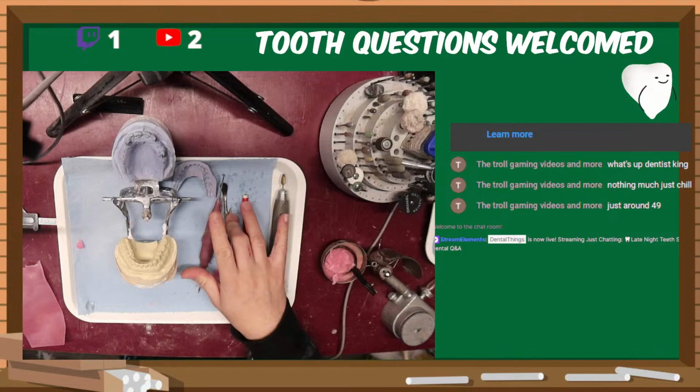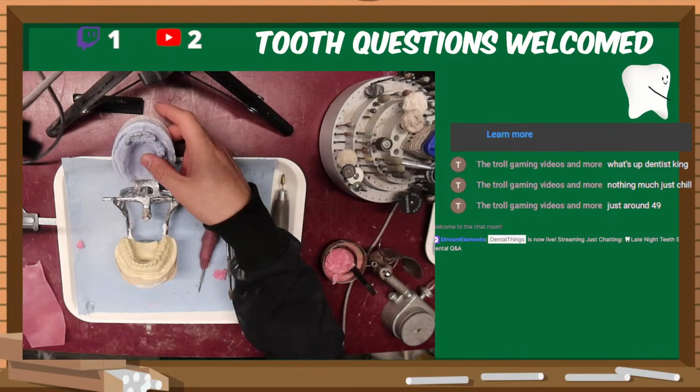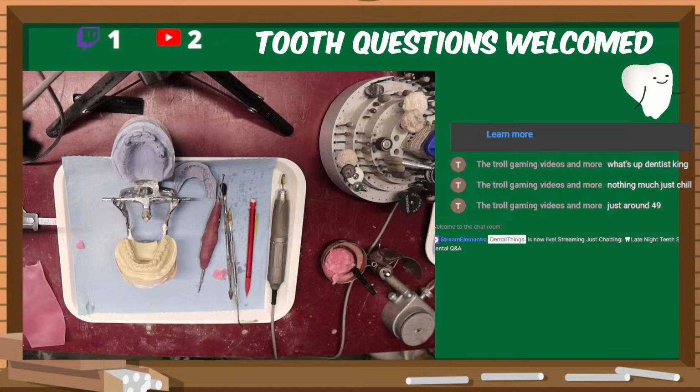Alright, so also on that I need to go and pick some teeth. I already mentioned I also need a canine and then a set of posteriors, so let me go find some teeth for this. And I guess it's a little easier to just bring my teeth over.